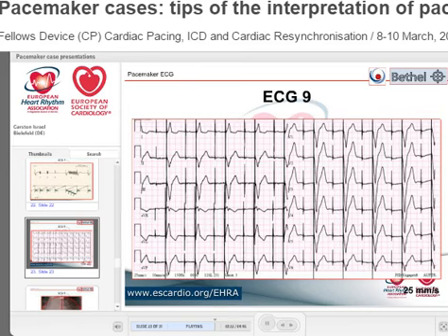So it is not exactly the same, and it's funny because I'm sure you all have looked at 1000 pacemaker ECGs. And obviously some of you never asked yourself the question, so this is called left bundle branch block, but only because of V1. In a natural left bundle branch block, there is typically a transition, maybe between V3, V4, but maybe also between V5, V6. And then you have at least an R. In pacemakers, if it's really in the right ventricular apex, typically not. You can have it, but in many patients, you have an S in V1 to V6. This is normal in RV apical pacing.